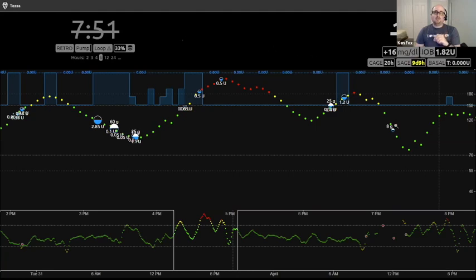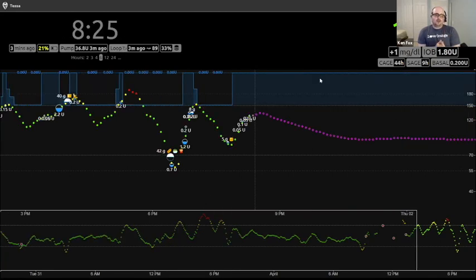Your tried and true information is always the loop pill if you're not sure which one to look at, and you can't go back more than 24 hours to look at real-time predictions. Now you can go to the day-to-day report like we covered in the last video to look at information, but in terms of what the prediction's doing, you really only have about 24 hours to work with. Okay. All right, so more pill hovering, and then we'll talk about the other stuff you can see on the graph here.